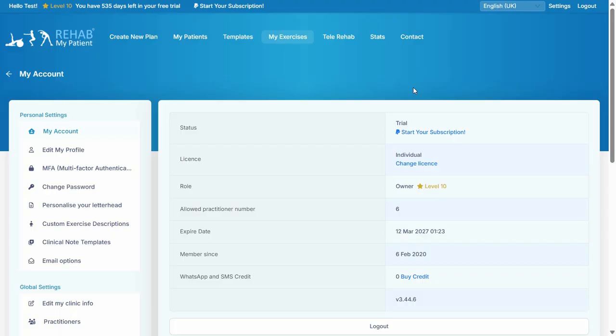Let's go through the settings on Rehab My Patient. The settings are brilliant. There's loads of customization and it's well worth watching this video.